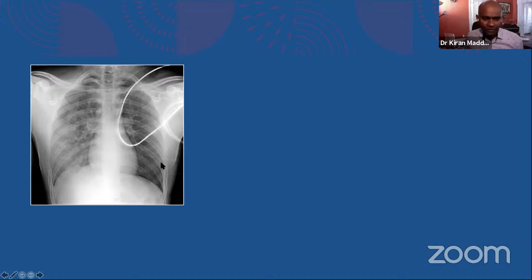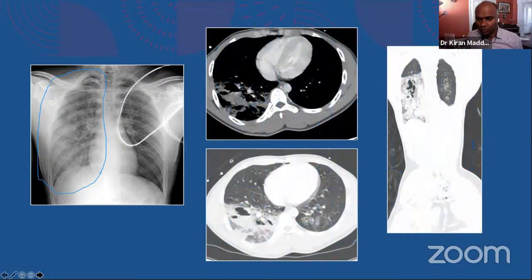If you compare the left lung parenchyma and the right lung parenchyma, you see entire opacities, and we know that we are discussing cases of trauma. So in trauma cases with lung opacities, the first thing that should come to your mind is pulmonary contusion. The entire lung is pulmonary contusion there, and you can see multiple opacities. But I'm also trying to show you some air pockets within the contusion. So what are all these?